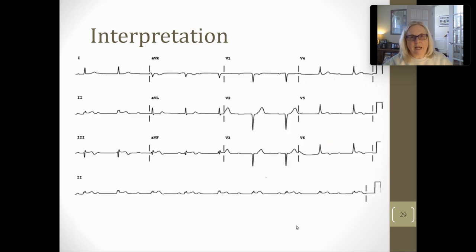Okay, so that's what we need. I think that's it for today. All right, let's do some practice. We're looking for those things I talked about today. We're looking for the ST segment to either be elevated or depressed. We're also looking for T waves to be inverted. Okay, so let's break it down by region.